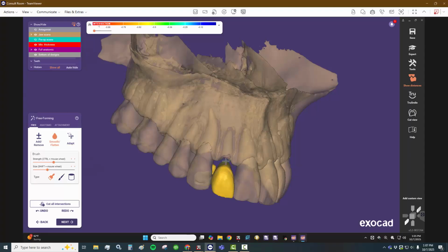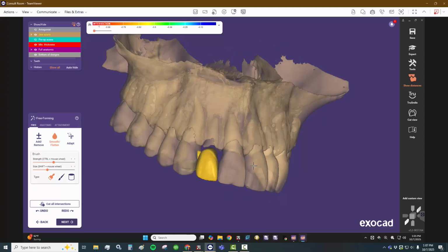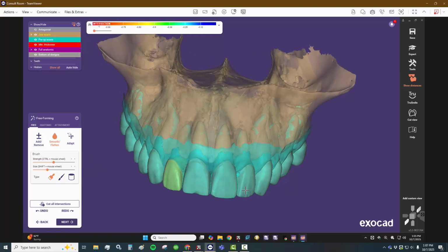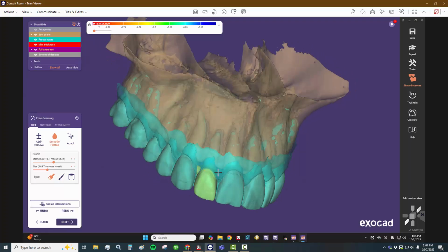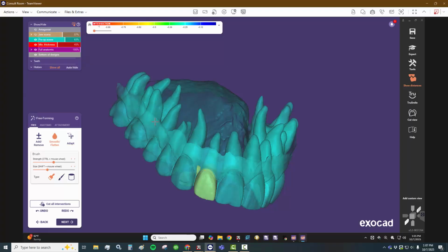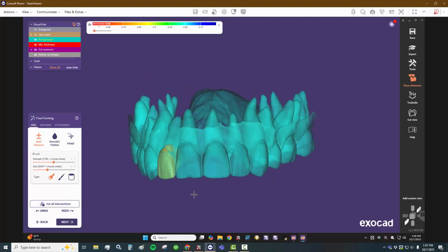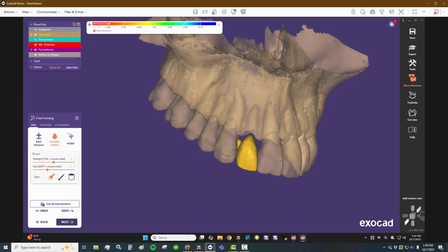The nice thing about this is this is data that you don't generally have. Now, if I turn on the tissue, you can see it's still supporting the tissue in the exact same place, but I have that nice ovate pontic in the shape of the root that I can move forward and simply export that STL. Now, if you wanted to build it up a little bit, we could certainly add a little material in this area. So there's lots of things that you could do here if you wanted to. And here would be my final design. You can see we're ready to go here.